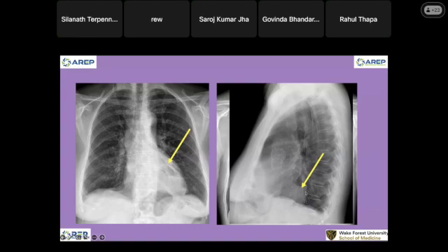It's not stomach. So this is an example of a hiatal hernia. Hiatal hernia has two types. One is a sliding hernia, where the GE junction is going above the diaphragm, and the whole thing is going up. And then the paraesophageal hernia. The right lung looks okay, but what about the left lung up in there?